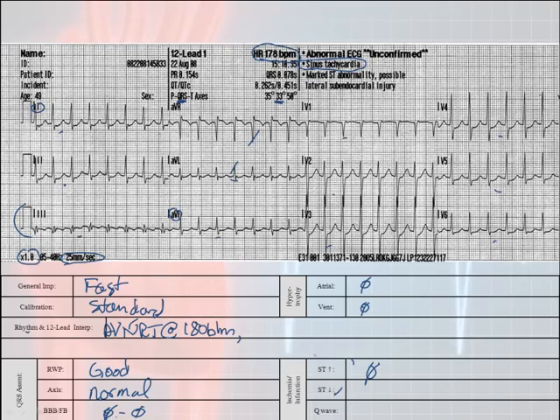Where is our ST segment depression? How about in lead 1, 2, AVL? It's going to be everywhere. So lead 1, 2, AVL, maybe V2. How about, looks like V3, V4. I guess I could have just put V2 through V6 and not put all of that stuff. Those are the biggies. Looks like maybe some in AVL and lead 1. So it looks like it's everywhere.